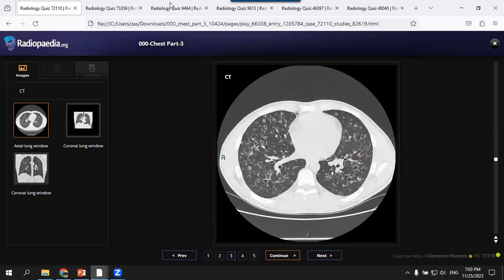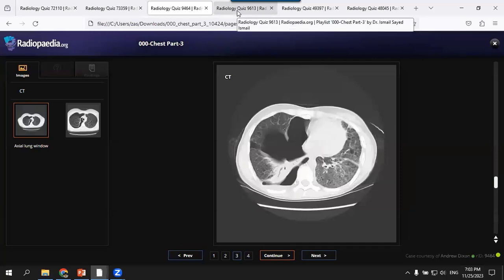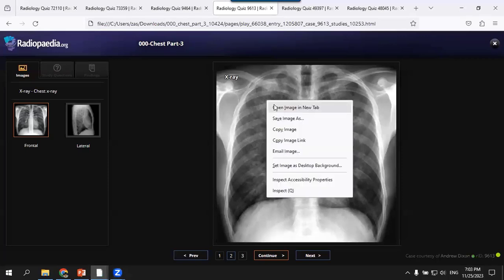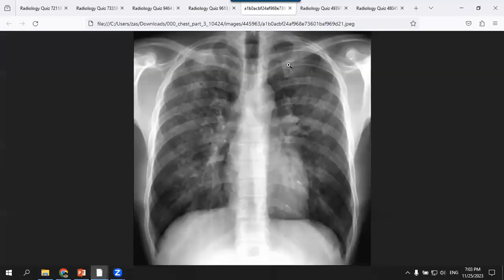Okay. Thank you. Okay, the next one. Come, Dr. Ahmed. You waited so much. Candidate 10 is there. There is candidate 11 also. Okay, candidate, don't be shy. Come. Okay, I'm here. Shortness of breath. Or I will not tell you the history. You suggest the history. Just comment on the film and suggest the history.